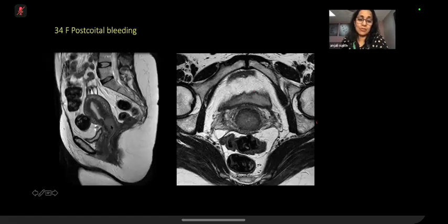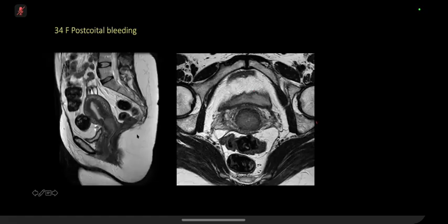Okay. So usually cervical tumors will be of intermediate signal on T2 and can be very clearly seen separate from the bulky middle layer of fibrous stroma. Now, if you're actually seeing a layer of T2 low signal fibrous stroma all around it, then you can say there is no parametrial invasion. Okay, so this tumor is confined to the cervix, and so this will be a stage 1.